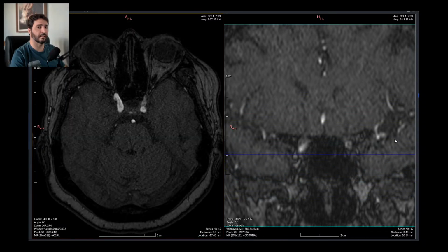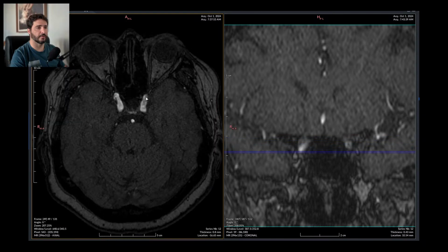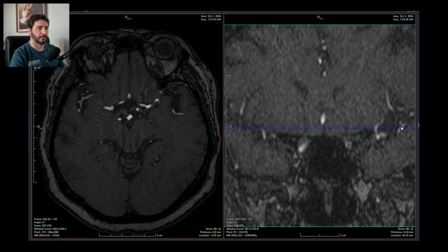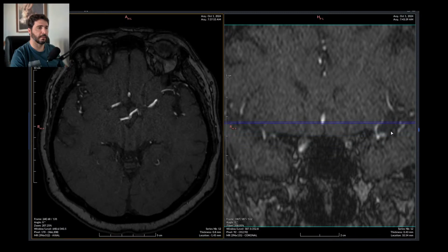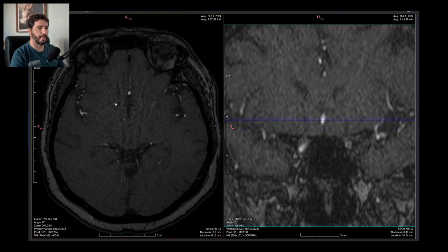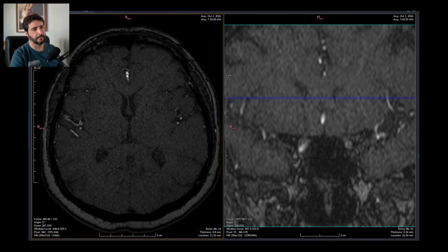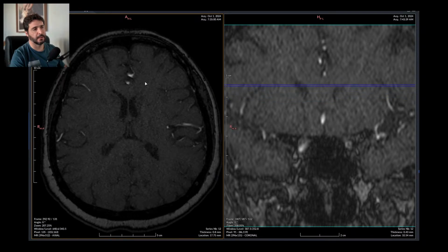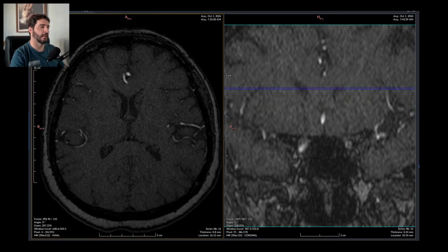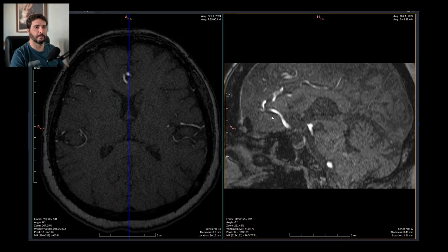Usually stenosis are in the carotid, on one of those very closed curves. Right there. Nothing major. There might be something right here, almost at the site of the pericallosal artery. Let me just check the sagittal view.